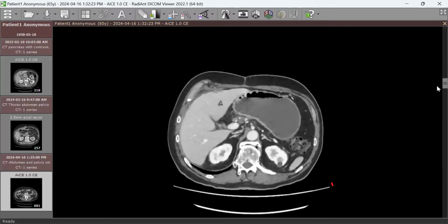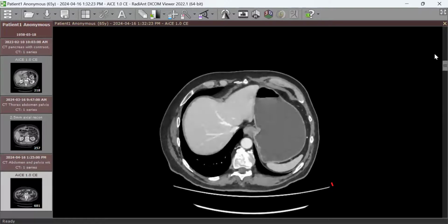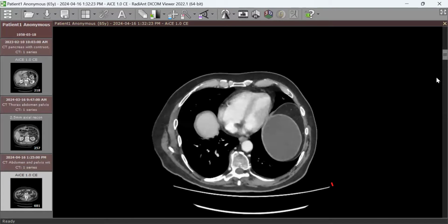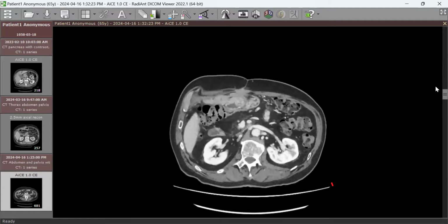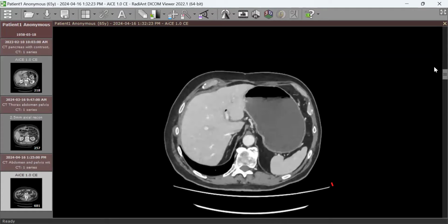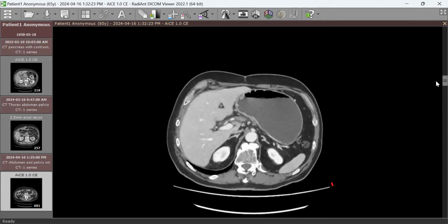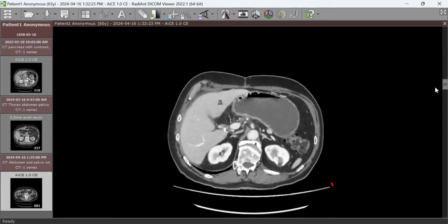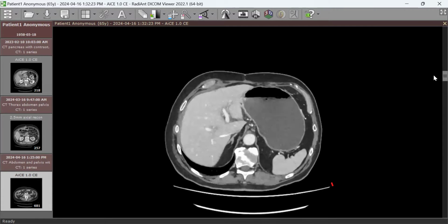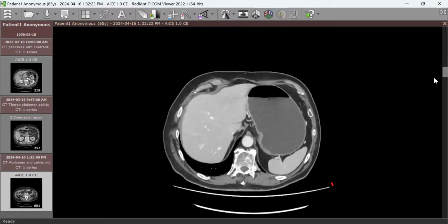So I didn't give you the information because I wanted you to review the anatomy, what you see. Sometimes they don't give you that in history. Either you have to identify it yourself and look to the patient records, go back to previous scans, of course, and see what happened. But here, I wanted to highlight the components of a Whipple procedure. So we remove it, it's a partial pancreaticoduodenectomy. So what happens here, you can identify 4 parts.